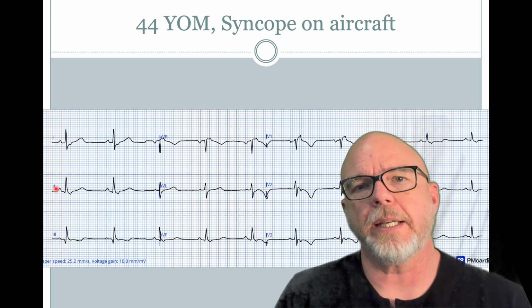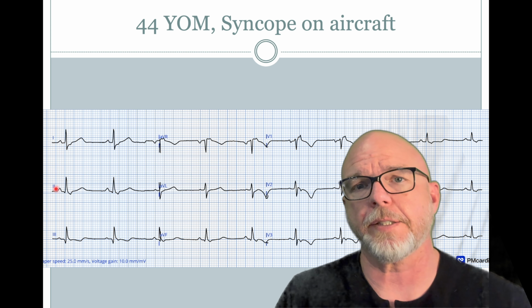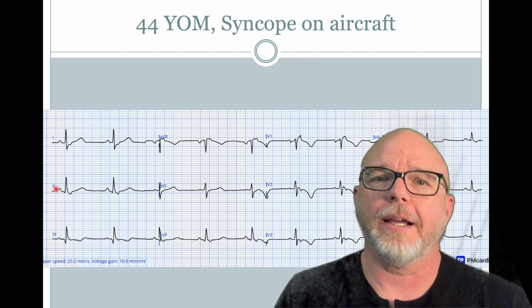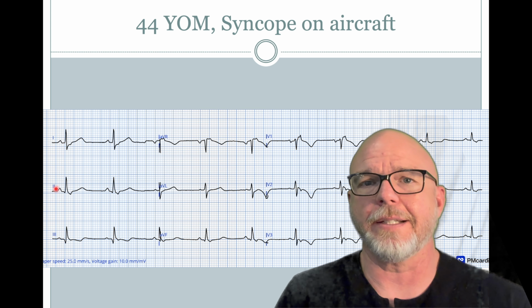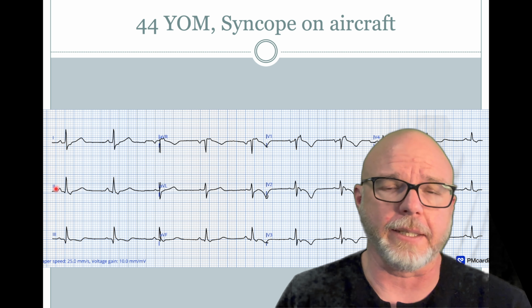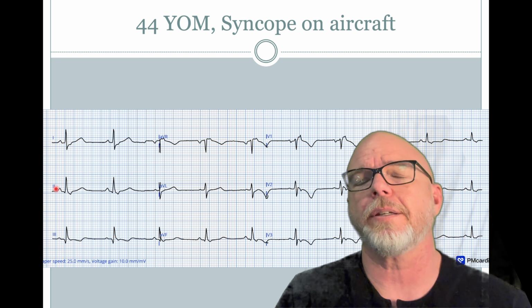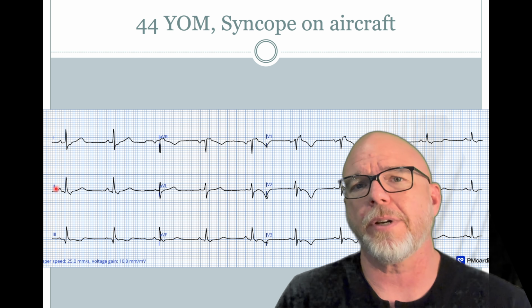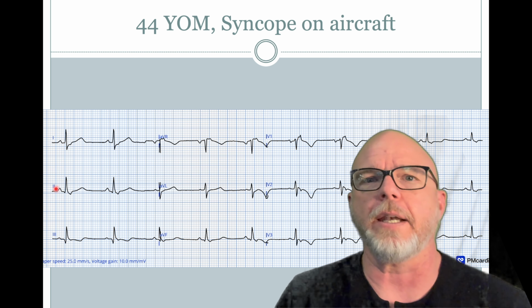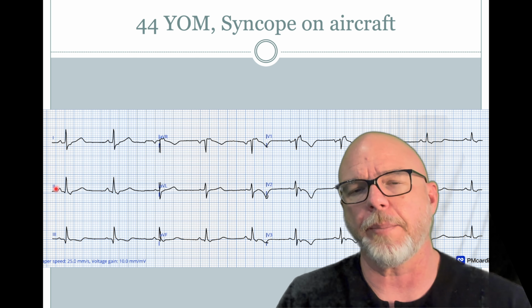So this last group of EKGs, a 44-year-old male had a syncope while on an aircraft in flight. The scheduled flight lands at your local airport, and you go out to take a look at them and get them checked out. This is really common, syncope on an airplane. I think there's something about blood pooling, maybe a dusting of hypoxia from the pressurized cabin, something like that. Whatever it is, people start feeling hot and nauseated, start feeling that terrible feeling coming up.